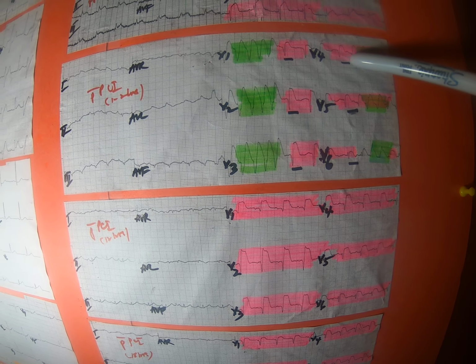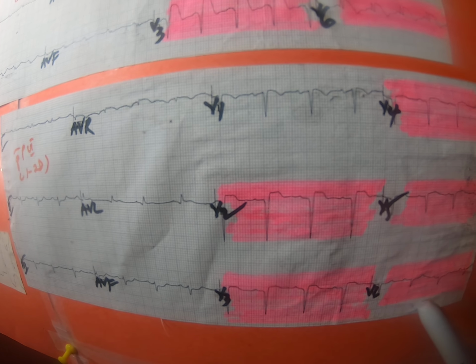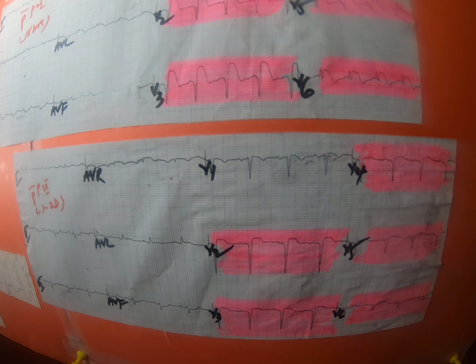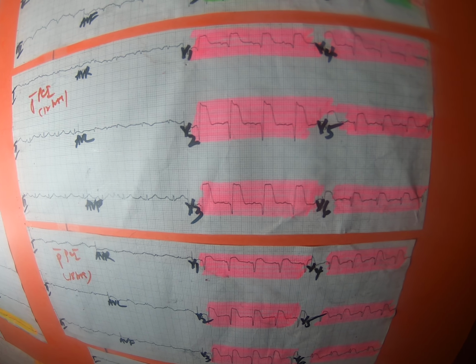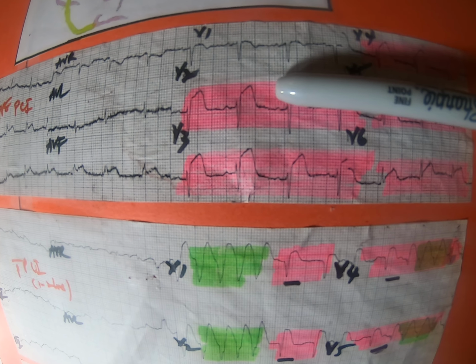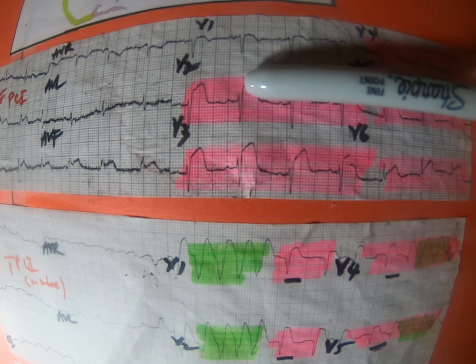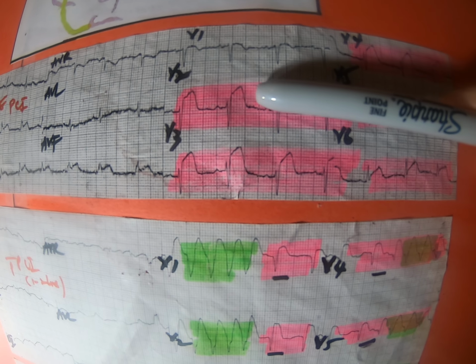After a day or 2, the patient was responding slowly, and we notice now that the STs are coming down, but we have deeper Qs. The Qs tell us about infarcted cells. The STs are the tissues that are vulnerable to dying or living, so they tell us that we can save these cells. They are injured cells. If we act quickly, or the patient came in earlier, we will be able to save most of the injured cells. But if they come late, then that's a problem.